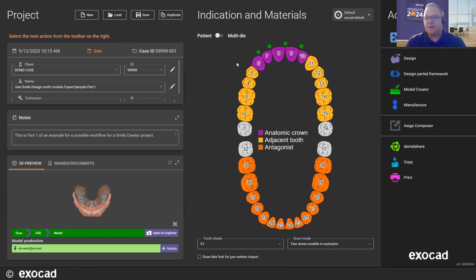If it's just for the patient to try on to see, obviously it depends which teeth you're trying to cover with this workflow. But if you're having sequential teeth, if you don't do that, essentially you're going to have a separate piece for every tooth location, and for placing in the patient's mouth, it's a lot easier to be splinted or as one piece.